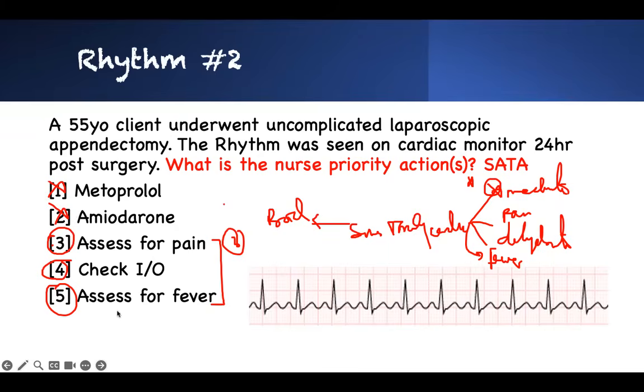But you have to pick those that you're confident about, okay? So select those that you're confident about. And if you're confident about 2, just choose it. Okay, just choose it. But this is how you go through the EKG.